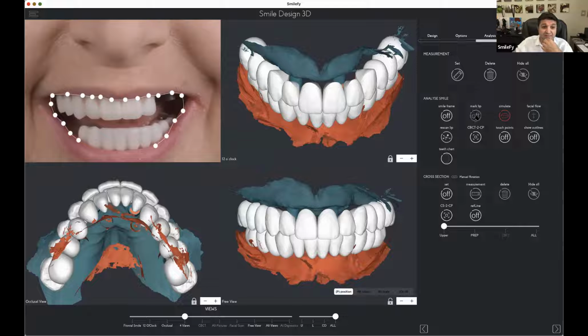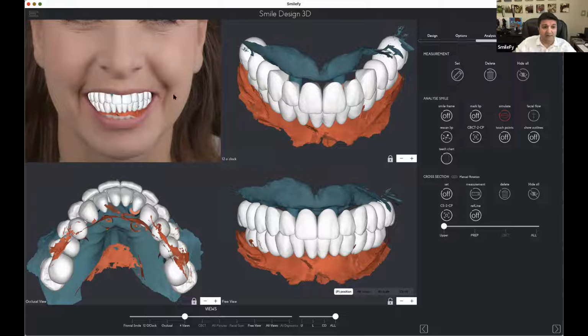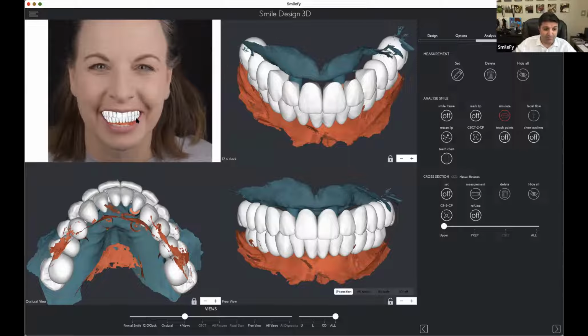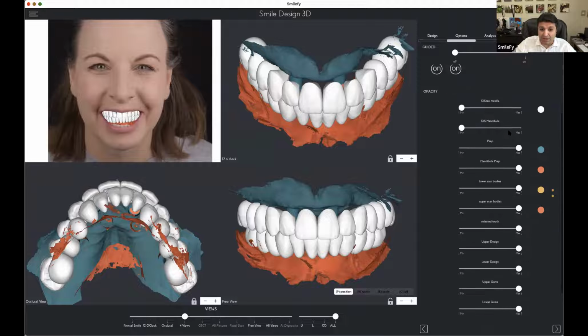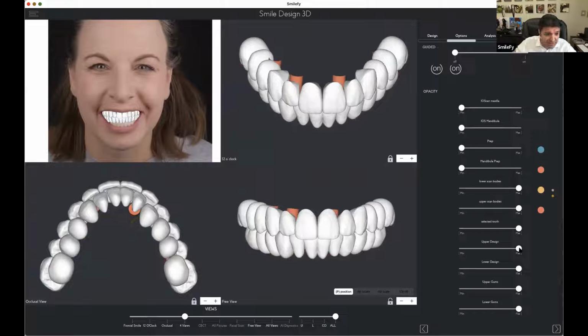So that's something that we're gonna of course correct. So now let's go here, and I'm going to show you some really cool options. I have here something that I don't like very much, but we can adjust here a little bit.